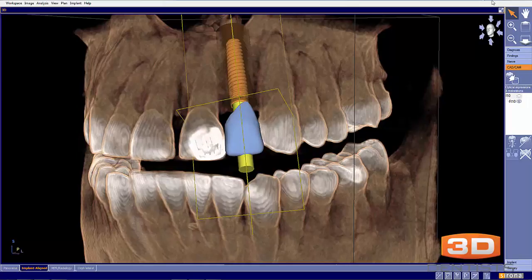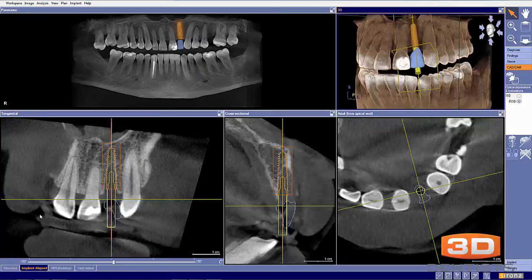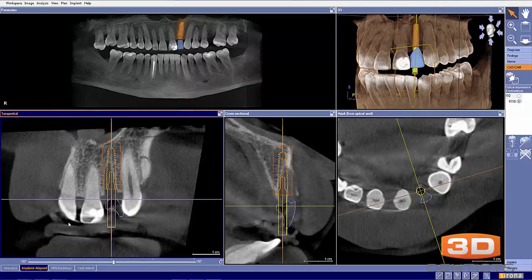So I would like to see that a little bit better. The other thing I also notice is right in here, our incisal edges are going at quite a bit of an angle. So if we compare that to doing something along this line right here, we can see that our incisal edges 8 and 9 are much more flat in this particular angle here.